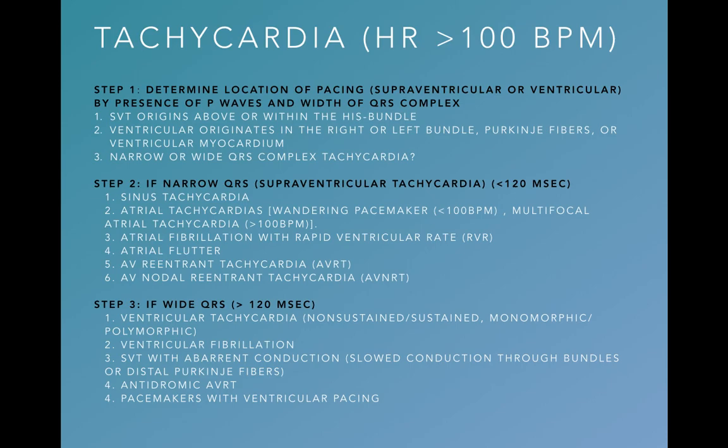Also, if you see a wide QRS, you want to look for pacing spikes because the patient might be healthy with a pacemaker placed, because pacemakers will have a wide QRS if it's ventricularly paced.